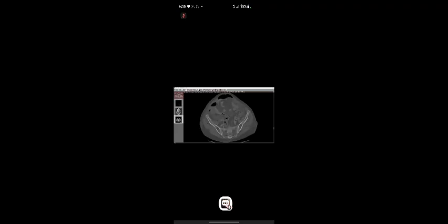You see this thing is free air. It is not in a bowel loop. And you can pick up right and left small bubbles here and there. So this is a case of pneumoperitoneum. And in this case, as we go inferiorly, you can see even fluid going all the way into the pelvis. Even in the pelvis, you can see these air bubbles sitting inside.